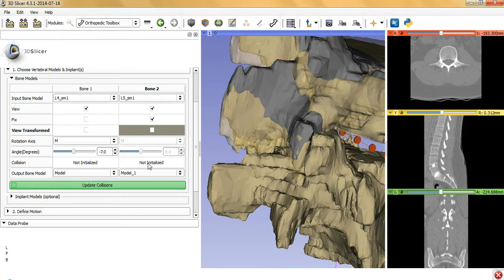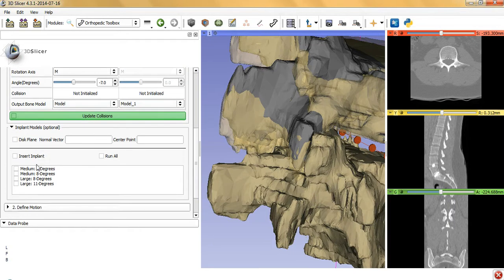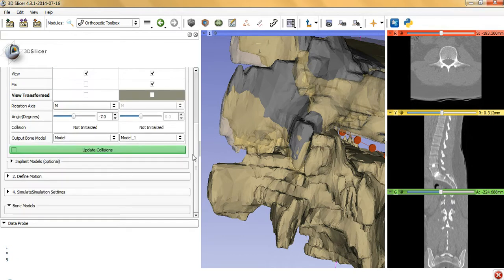So from the mathematical standpoint, this is happening in real time. It's just a matter of me connecting it. So that's the next logical place to go. And like I said before, you have implants, and this is definitely going to change. I'm not exactly sure how yet, but that's something for this week to do.